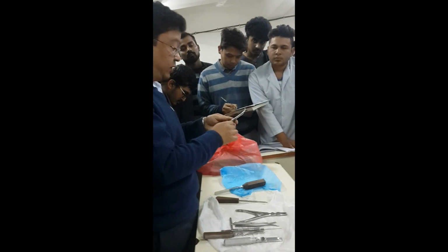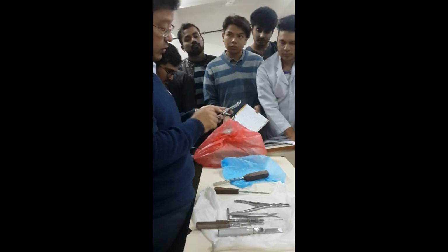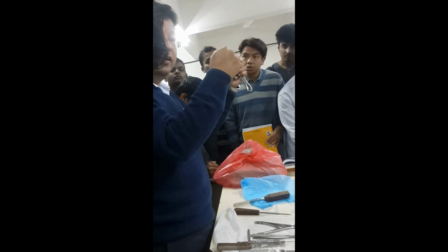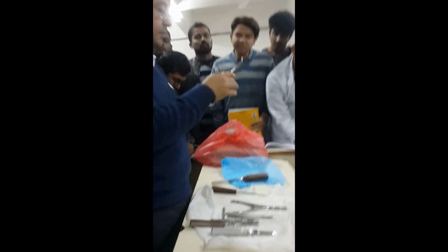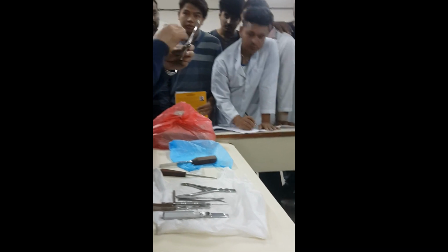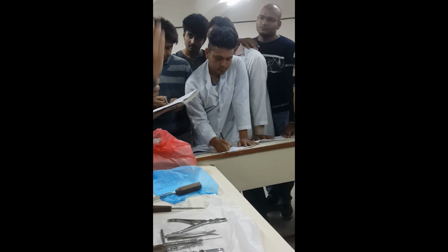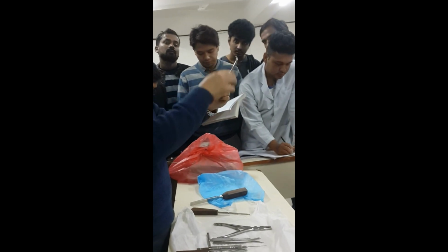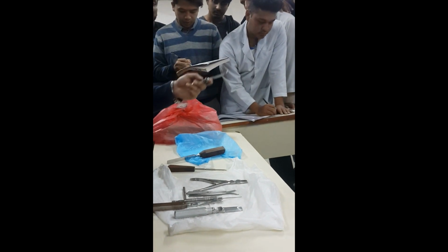Similar to this, we have, we don't have it here, but there is another instrument known as the bone and plate holding forceps. Now this one is only holding the bone. How do you recognize the difference? This one is symmetrical. The plate holding one will not be symmetrical. For the plate holding, there will be a different type of curve and more serration. If it is bilaterally symmetrical and you have serration, that's a bone holding forceps.